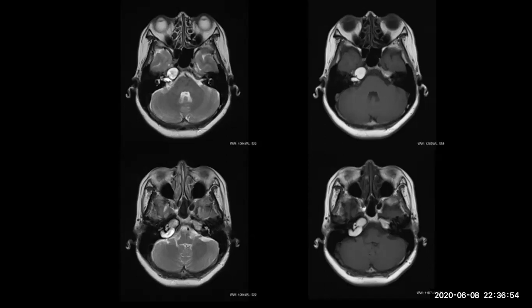Sorry, sir. One of the differential diagnoses is osteitis of the apex of the petrous bone. Osteitis, yeah, but with that it is not well defined. Exactly, yeah. And I think it is hypointense in T1. Yes. Other differential, they put in the book hydrated mucocele. I don't know what hydrated mucocele is. They said it is rare.